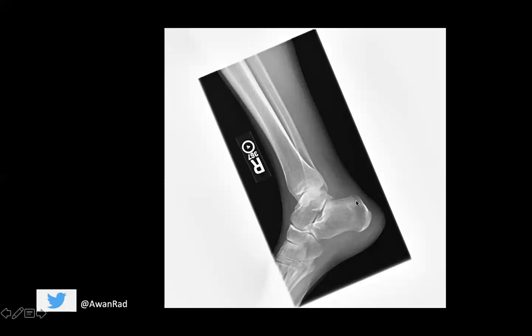And often stress fractures don't necessarily have to have a break in the cortex. They can manifest exactly like this, an area of microtrabecular sclerosis that runs perpendicular to the long axis of the bone. It can reflect as focal cortical thickening. There are a lot of different imaging manifestations of calcaneal stress fracture.